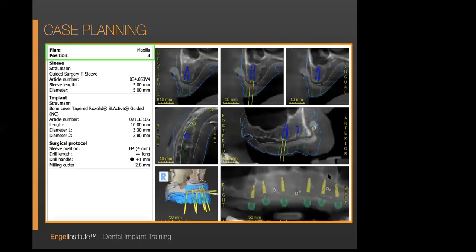I hope so. Okay, so now let's talk about design, okay? And this is really, really important here, okay? There are a few variations. I mean, you could be placing any number of implants. You could be using any type of drill kits, et cetera. So I'm gonna give you the basics that would be pertinent for anything. And I'm also gonna skip over some of the stuff that is like guide surgical kit conducive.